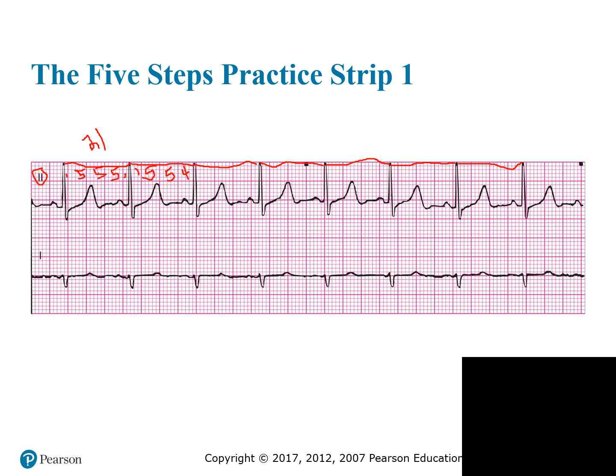And then we have 3 here. It's a horrible 3. So that's 5, 10, 14, 15, 16, 17.